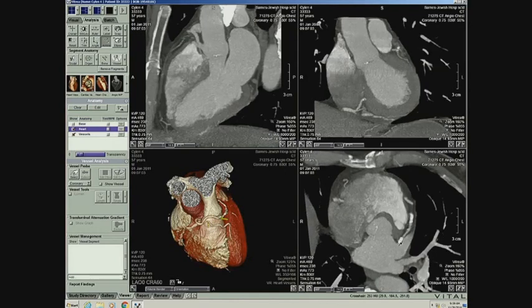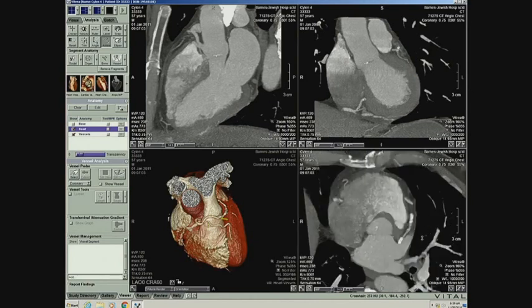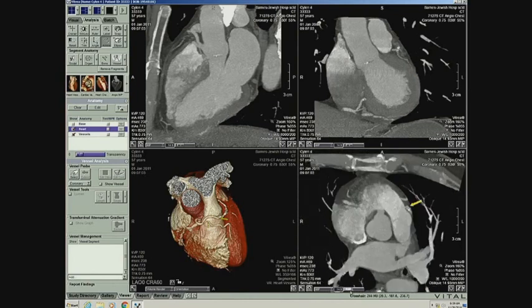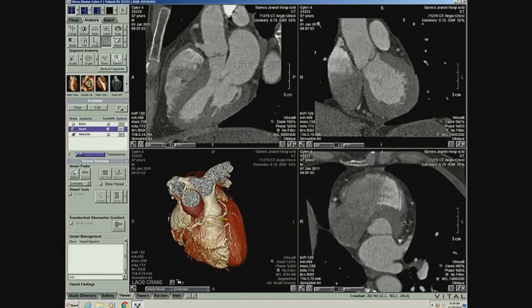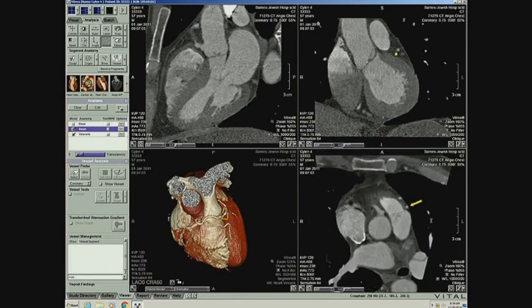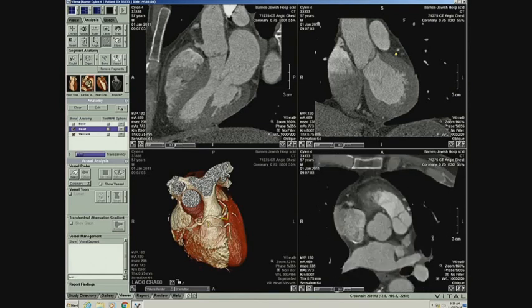Eventually it comes backwards and goes into the left atrioventricular groove between the left atrium and left ventricle, so it's a circumflex. And when you see an anomaly like this, because the circumflex is traveling where the proximal LAD would have come, sometimes we see small septal perforators that we would have expected to come off the LAD, come off of that anomalous course. Sometimes it even gives a branch similar to a diagonal. That's not unusual when you see an anomaly like this. So prepulmonic course, it bifurcated right over here, anterior to the pulmonary artery.